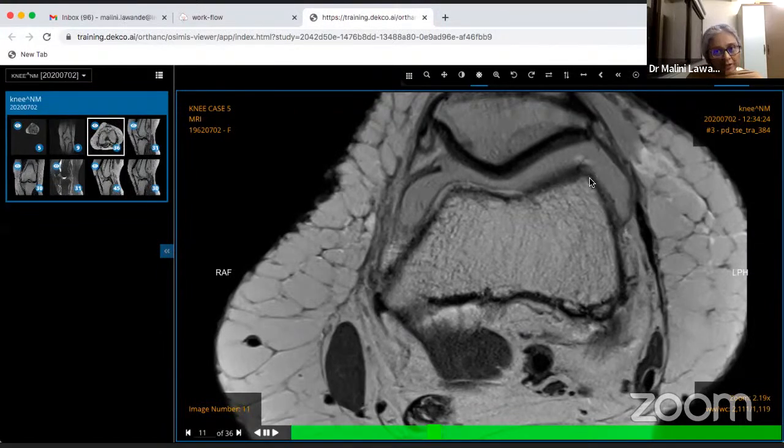If I see synovial thickening, then I start thinking, can this be infective? Can this be inflammatory? Sometimes it can get very difficult to distinguish between the two, and we give a differential diagnosis. But we can try. If it is irregular kind of synovial thickening, then it's more likely inflammatory. If it is smoother, then it is infective. If there are surrounding abscesses, if there are more bone marrow erosions and all of that, infective is more likely. But as I said, it can sometimes get very difficult.